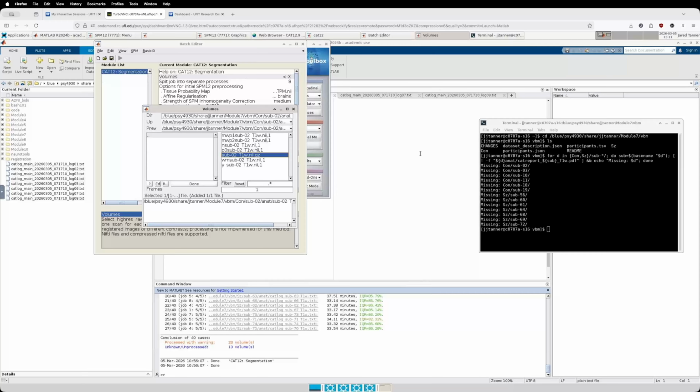And so that's subject 2. Now I want to go to subject 3, who's missing. Again, do the ones that you're missing, if any. So the same process. As we see, within subject 3, it looks different.